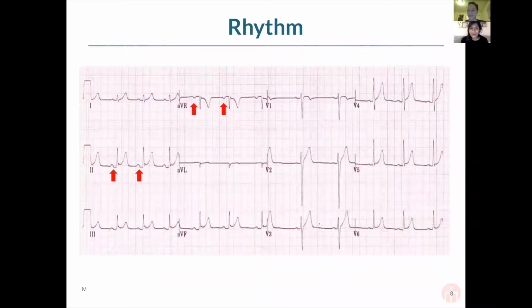Awesome. So the next thing that Justine mentioned, that when you're doing your systematic approach to going through EKGs, the next thing that I look at, and I think that most people tend to look at, is the rhythm. And so rhythm can be really challenging, because sometimes when you're on the wards and when you're working with clinicians who have looked at a ton of EKGs, they can pick out the rhythm just like that. And you're like, wait, I don't know how you necessarily came to that conclusion. And so I think it's really important to have a systematic approach just to doing the rhythm itself.